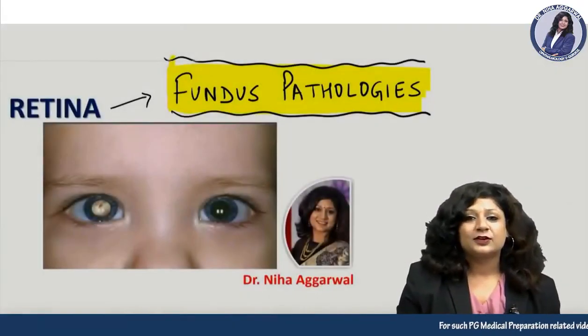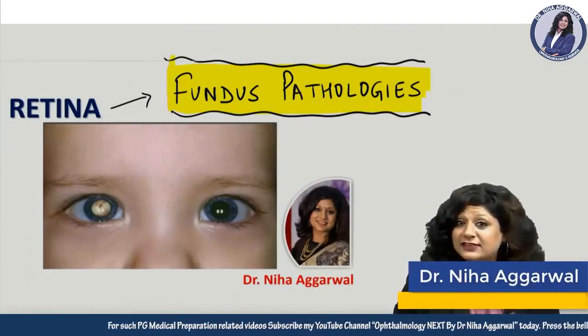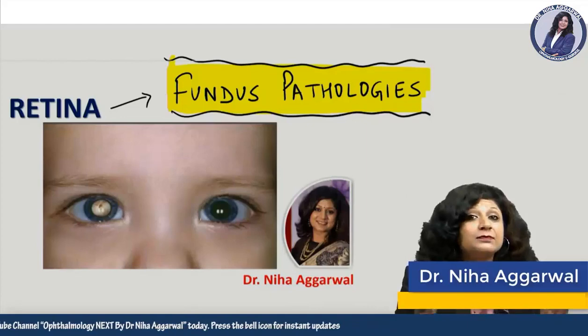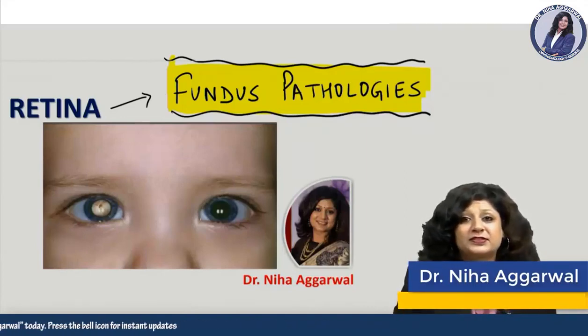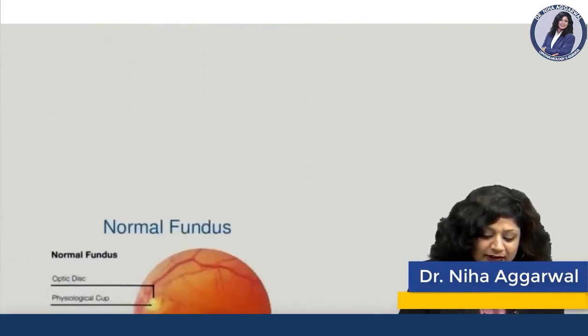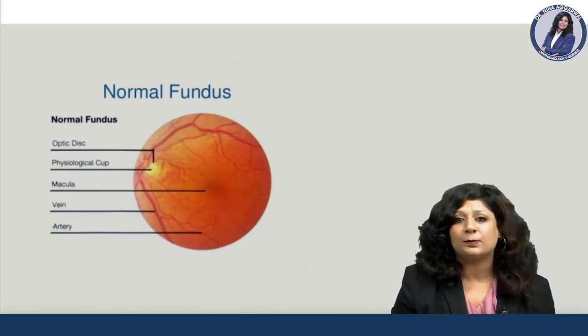Hello friends. So today I am going to take a very important topic, a very interesting topic and a very dynamic topic which I have got an unbeatable amount of requests to take, and that is the fundus pathologies. Now before going into the details of the fundus pathology, let's have a look at the normal fundus.